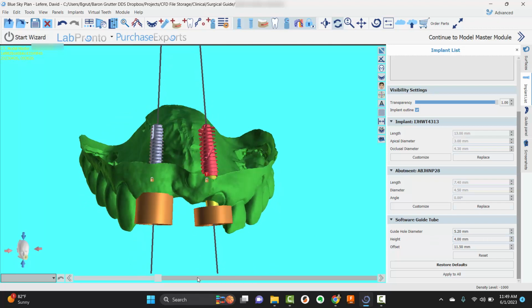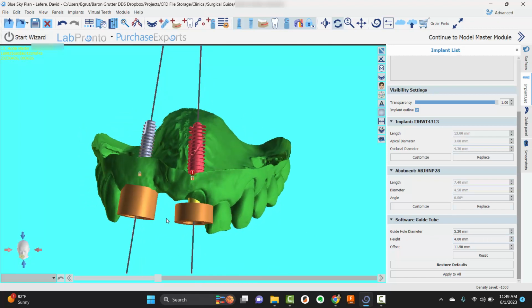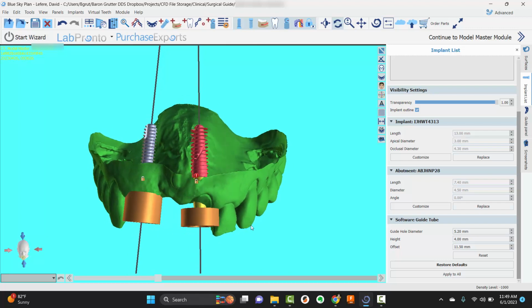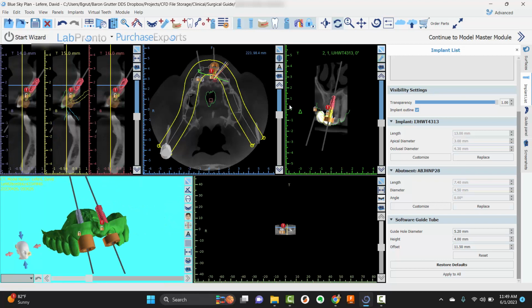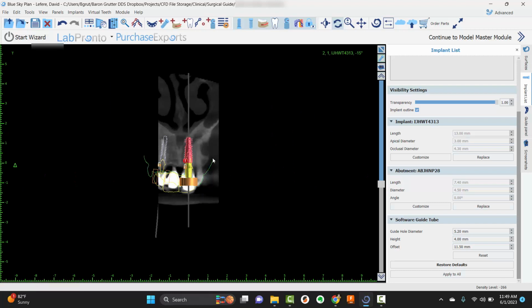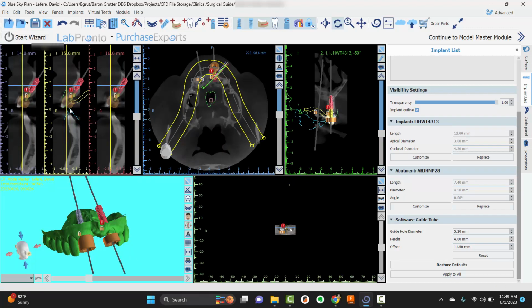And this side by side is a great comparison because my default of 4 millimeters is usually adequate to give us good guidance here. The problem is in this case, I'm going to now. Let's just click on this front implant. Let's center it here, and let's just look on the profile. You'll see that, well, it's not great. Let's see if the other one's any better at this.